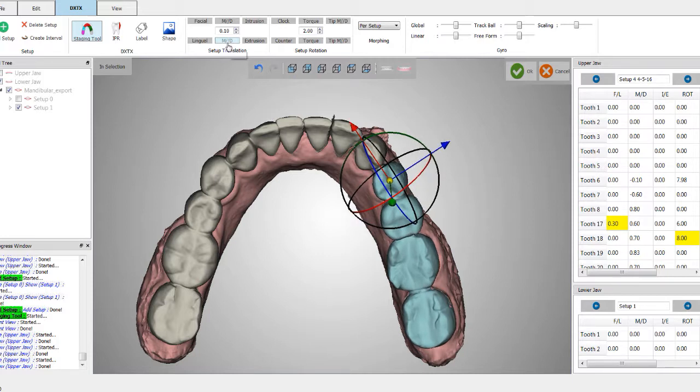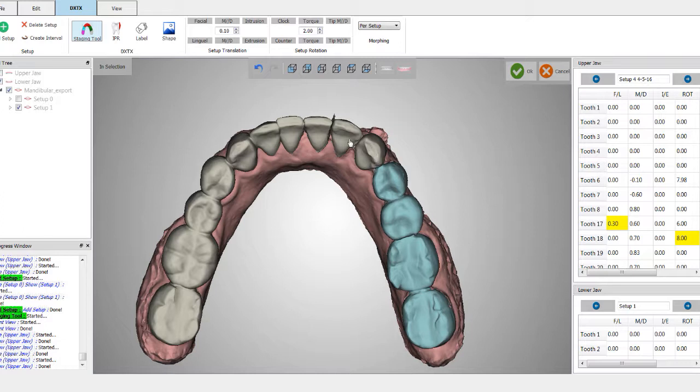Now, is this happening clinically? No. It's no different than placing an open coil spring right here, okay? If we have fixed appliances on this case, it's no different than placing an open coil spring there, okay? So what's going to happen clinically is that we're going to get, probably mostly, some advancement of those anterior teeth, and very little distalization of this posterior segment.